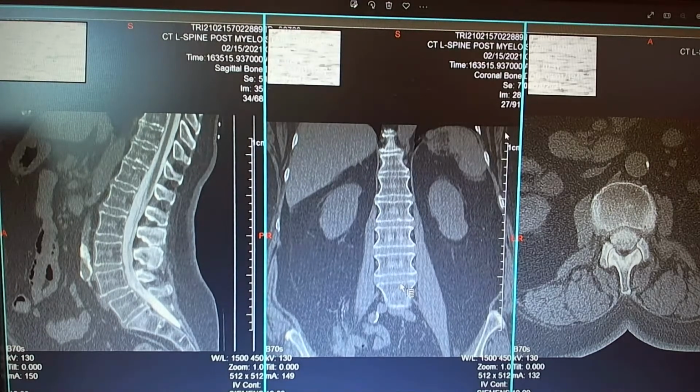Yes, the peritoneal cavity can be used for dialysis, Neil, correct. Inferior vena cava, correct. For that reason, you need to understand the inferior vena cava can be round if there's lots of fluid in it, or it can be any other shape if there's pressure on it.